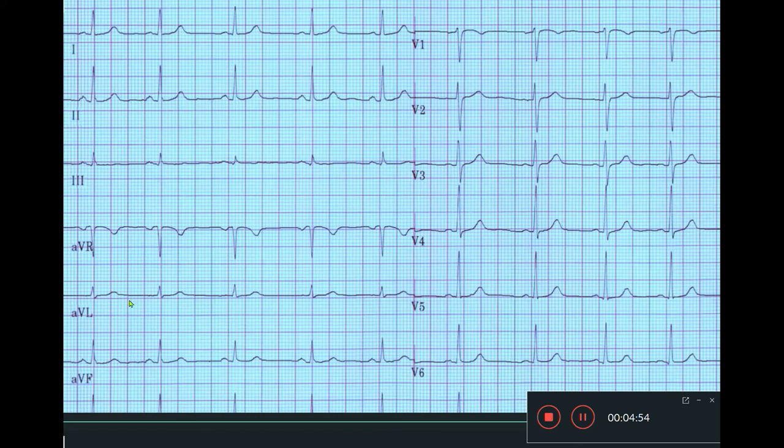It is not a true isoelectric complex because R does not equal S, but it has an S wave, and the rest of the complexes don't have an S wave. So AVL is at minus 30 degrees. What is perpendicular to minus 30? Plus 60 degrees. So the axis is at plus 60 degrees. Rate, rhythm, axis.